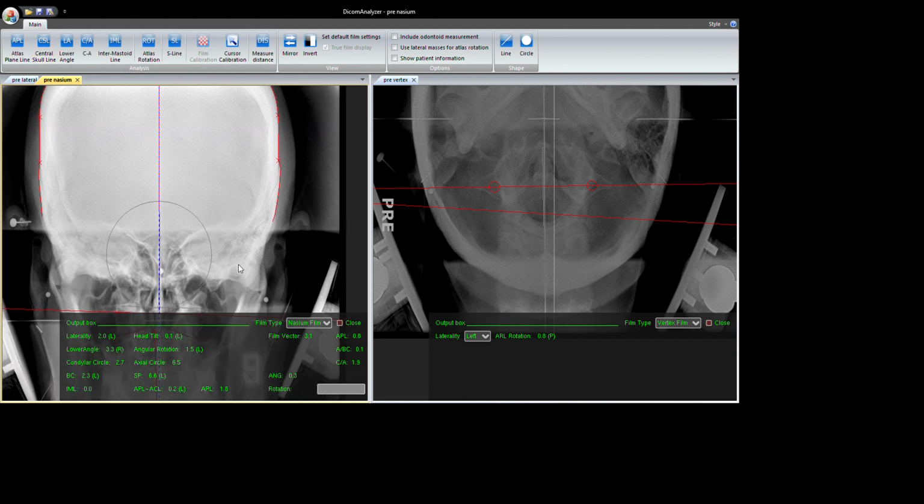And what I've got is a perfect double pivot point system over this range, in terms of where the X's are drawn. That way, when you're doing your post X-ray or reanalyzing or looking at somebody else's images, you can see the part of the skull that was analyzed. If you reproduce that, you'll notice we have a 2-degree laterality, 0.1 degrees of left head tilt.